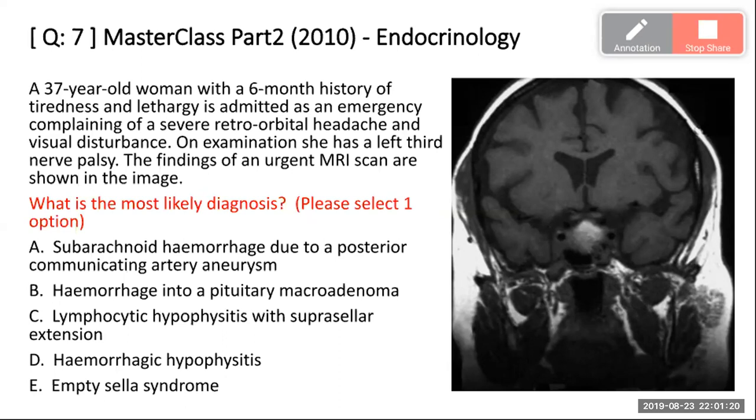It is just like tumors, but the pituitary stalk widening, along with the clinical history, gives us a hint. When we see a woman after birth, or with an autoimmune disorder in herself or her family, we will think about lymphocytic hypophysitis. This image is a coronal image without gadolinium enhancement, which is a good point to base on.